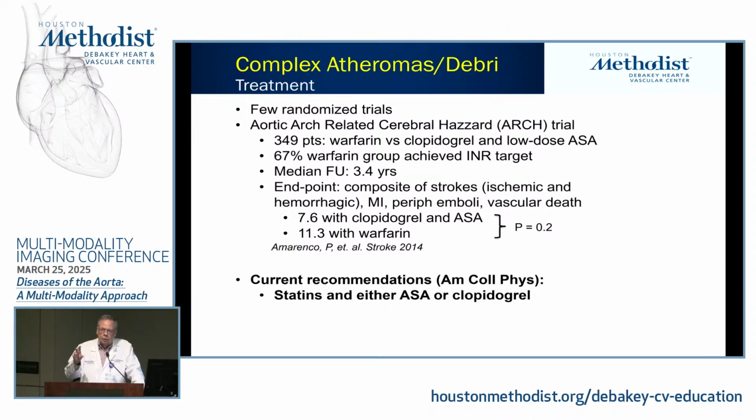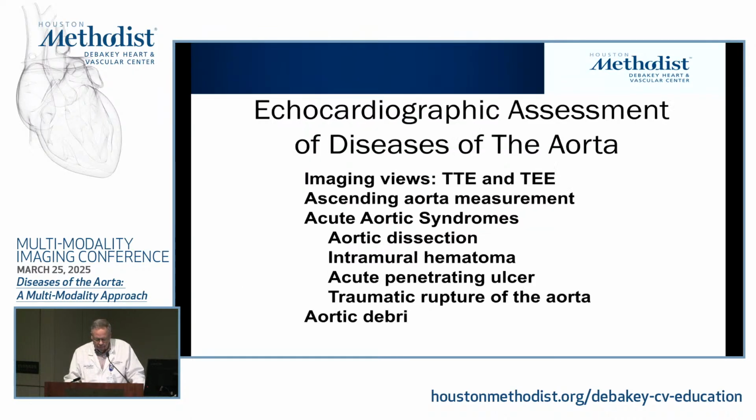So when you're looking at older patients that you're doing TEEs for strokes, any abnormal, irregular, large atheroma with any type of debris, if present in the descending upper part of the aorta, can be a source for embolization. Now, obviously, if you only see them way down in the lower portion of the descending aorta, then it's highly unlikely that they'll be able to travel all the way north. Those can, of course, cause peripheral embolizations towards the toes and extremities and so on.